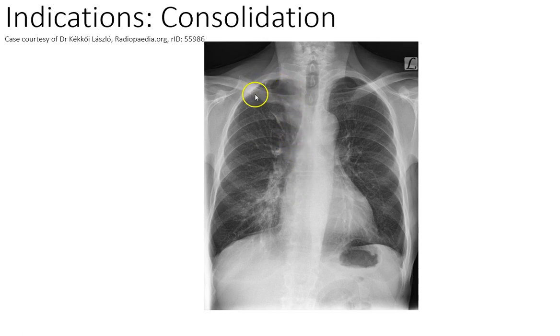I'm now checking to see the lung markings all the way to the edge. And yes, no concerns there. That means there's no pneumothorax. However, I have noticed as I'm looking at the lung fields, this line, and I'm intrigued by that. It's certainly not an indication of consolidation. So it's perhaps just another interesting finding on this film that's been posted on Radiopedia.